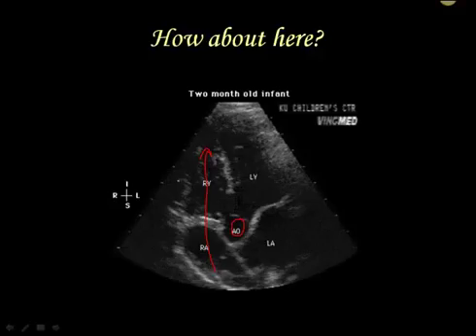If we flipped it 90 degrees, it would look pretty much like the previous image here. So it's going that way. Now I want to call your attention to something else. It has the appearance that there is an opening in the interventricular septum between here and here. Okay? That is a congenital defect, and it's called the VSD, a ventricular septal defect.